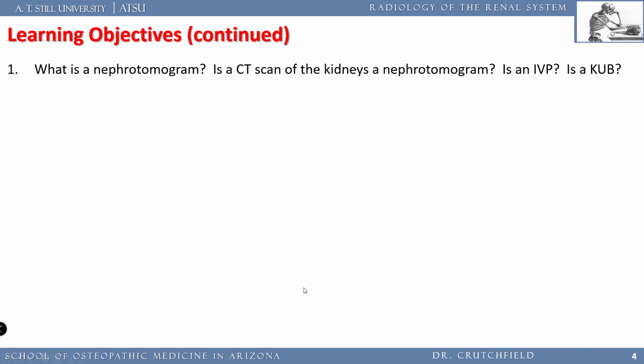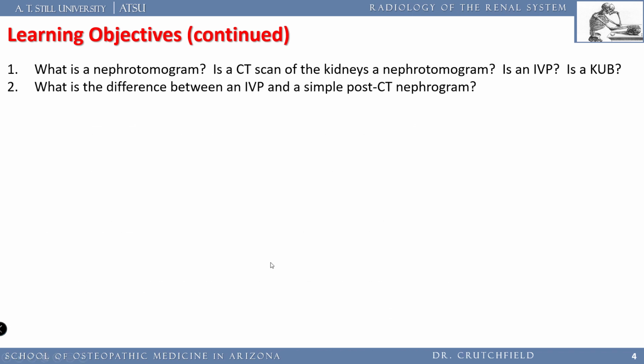What's a nephrotomogram? Is a CT scan of the kidneys a nephrotomogram? I'll give you a hint, it is. Is an IVP a nephrotomogram? Yes, it is. Is a KUB? No, it is not. What is the difference between an IVP and a simple post-CT nephrogram?